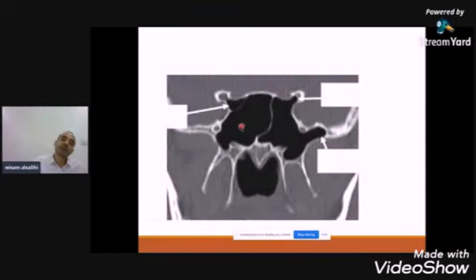This shows the sphenoid sinus, a sphenoethmoidal cell, and this is the optic nerve in it. This is the lateral recess, which we will discuss later on, and this is pneumatization into the lesser sphenoid wing and the anterior clinoid process.